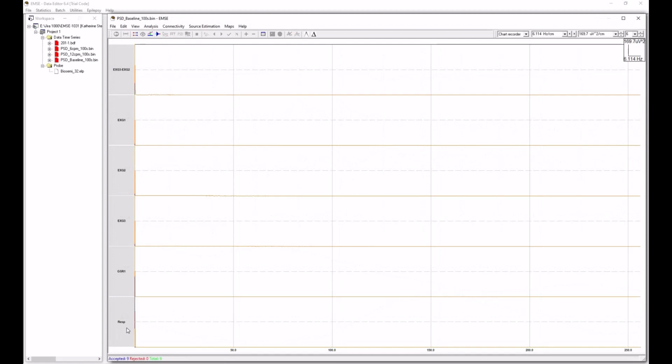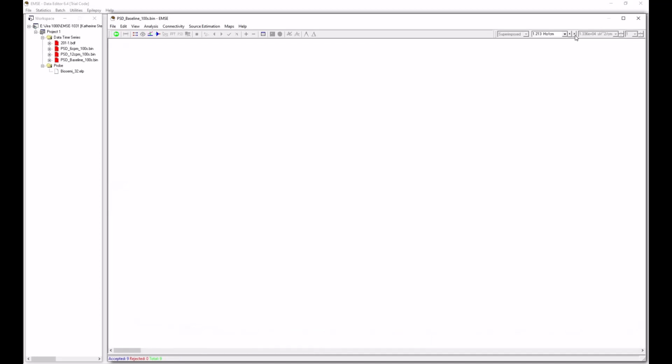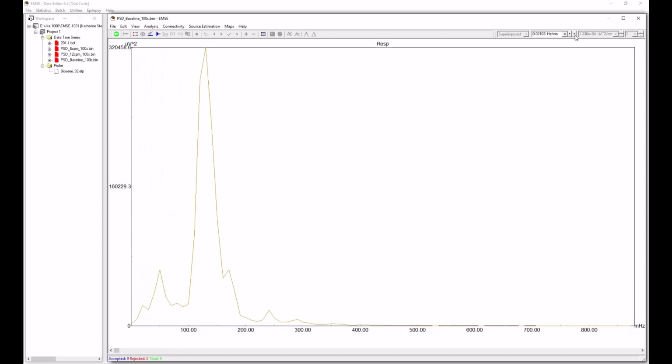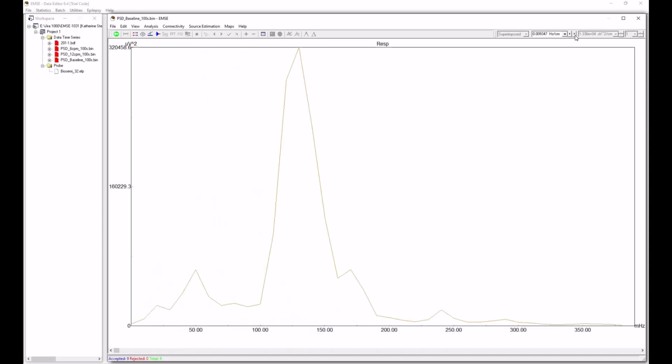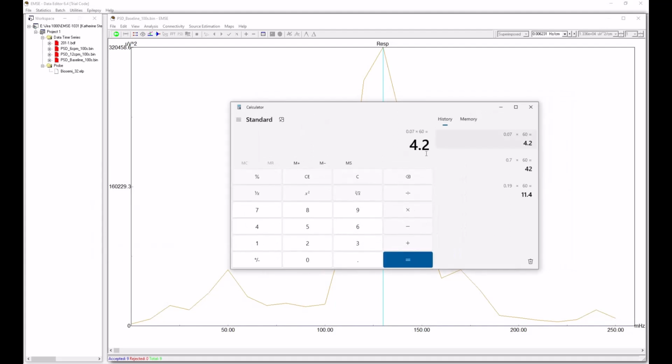And another thing I can do, I could just zoom into this one directly. I'll double click there. And we can zoom out. Okay, so here we have a dominant peak right there, although there are 2 of them there, but there's one. The peak is there, which is at 0.13 hertz.